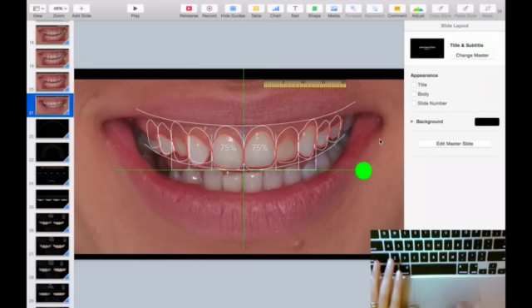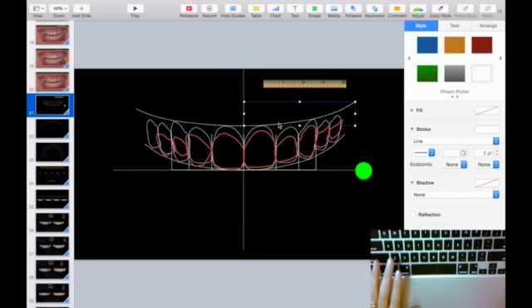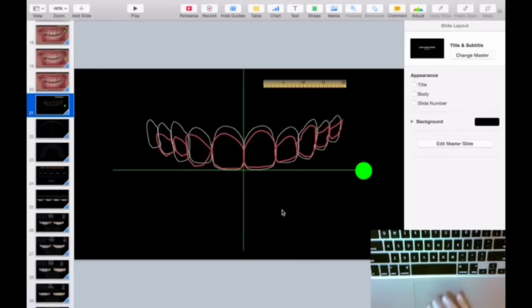And if I want to really get a great picture of it, I take all the pictures out and I only leave myself with the lines. Where they are and where they should be. So we have a better view of everything that's going on here.